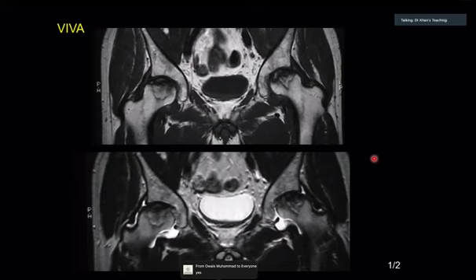And why do you want to do that? Just to see the progression. If the X-rays are normal, for example, a couple of years ago, or even 1 year ago, and the patient history suggests the patient is on a steroid, that may suggest that the steroid has caused a side effect. We can find the reason if they were normal and then history suggests the patient is on steroid. If not, then these are quite suggestive of avascular necrosis, basically on MR.